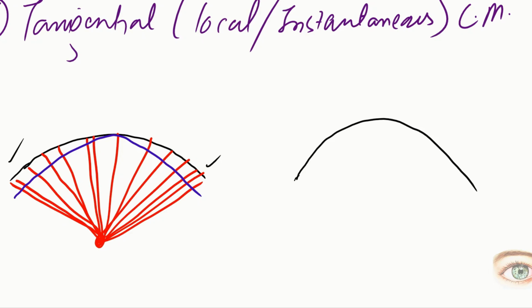But since the axial curvature map actually ignores the periphery, and the periphery flattens, it might sometimes miss very early keratoconus, right?